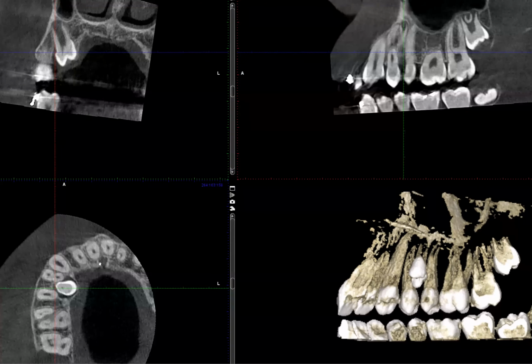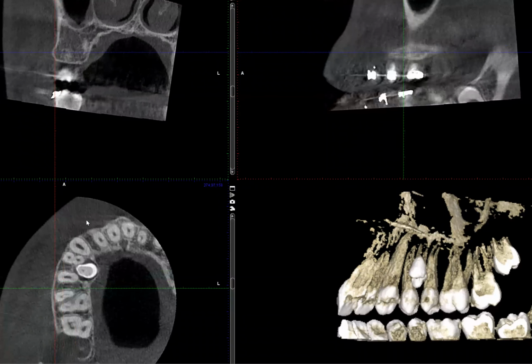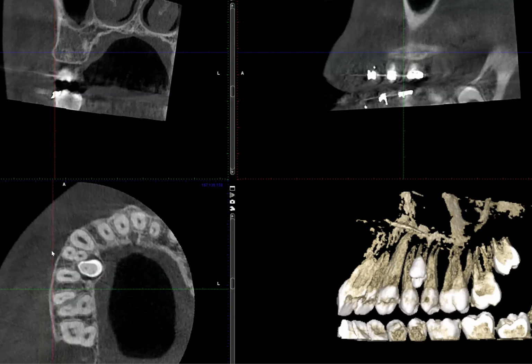So here you go. I would like to always start out with the axial plane. What you're seeing here is the axial plane going right through the roots of the maxillary right dentition. As you look at this premolar region, you can see that there's an extra tooth, a supernumerary, just parallel to these two roots, 4 and 5. You can see the enamel layer and associated expanded palatal cortical plate.